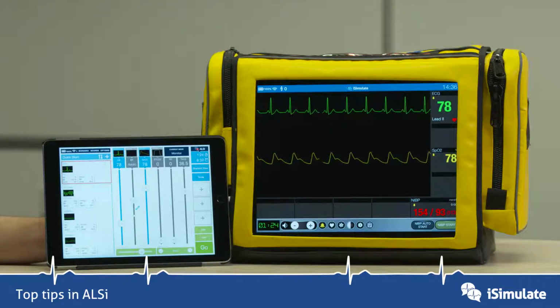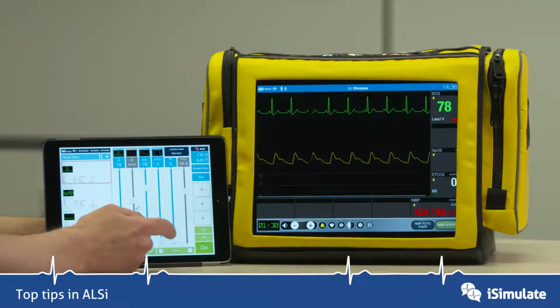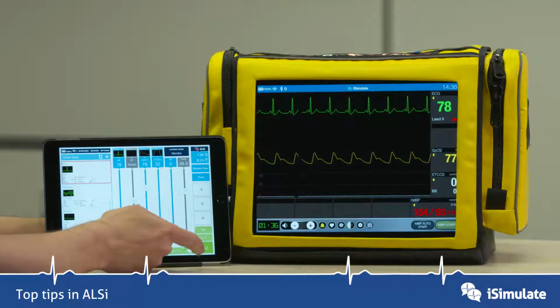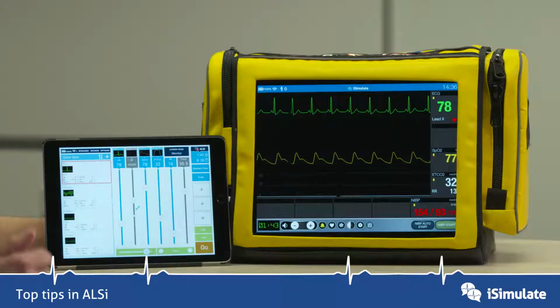If you want to add in CO2, this is my 4th top tip, by all means show it by pressing CO2 and respiratory rate, but if you put the CO2 up and press Go, you will not get a trace. So remember to always add a respiratory rate, and then you will get a trace occurring on the CO2 line.